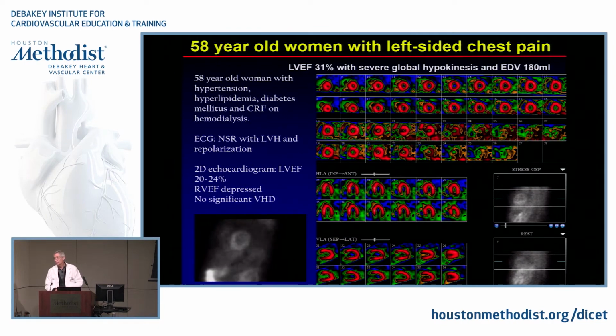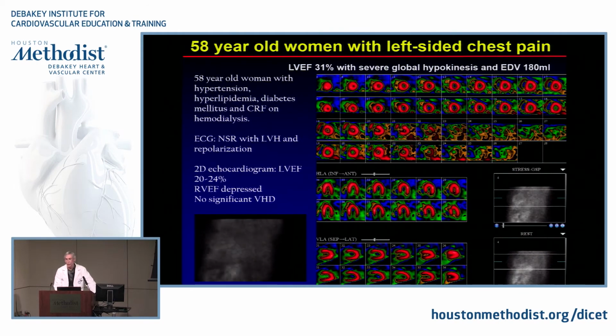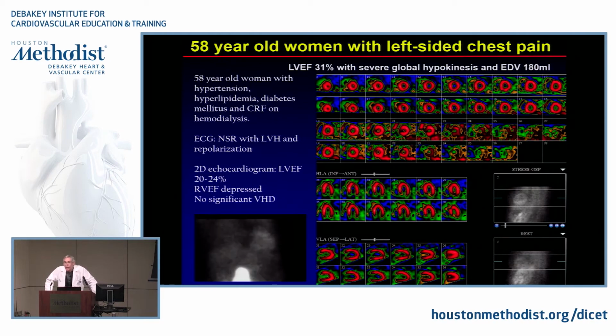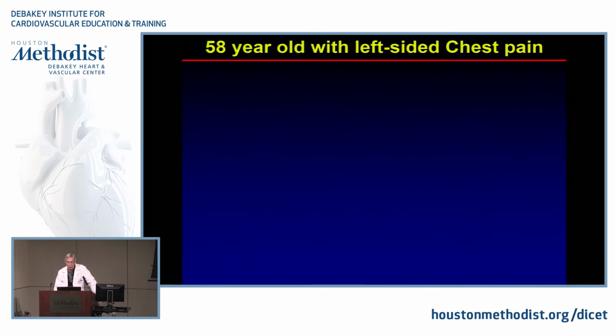Why do you say that? Well, there's the halo surrounding the heart. Yeah, there's a circumferential blackness that's photopenic around the heart. And in fact, that would be highly suggestive of a pericardial effusion.